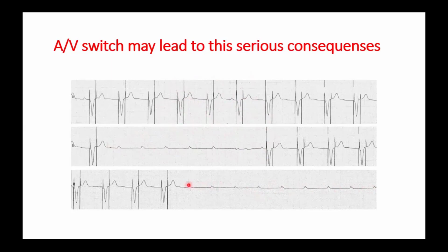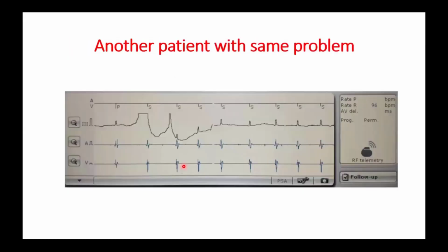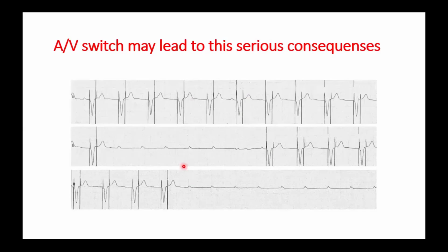As history, the device thinks that this is like a VT. Or an accelerated ventricular rhythm. Exactly. You know why it started not, it was starting good? Because it could not sense the small P wave before the spike. Exactly.